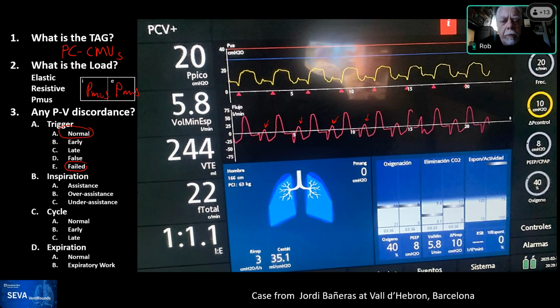Different ventilators have different refractory periods. What that means is every ventilator will put in a short period of time right after the breath ends, after flow goes through zero, where during that time no trigger effort will be recognized, so that you don't get breath stacking. Ventilators build that in for every mode that has mandatory breaths, but there are no clear rules, and oftentimes you can't even tell in the operator's manual how long that period is. So that was probably a more likely explanation, because that peak in flow crossing zero is still very close to the end of the preset inspiratory time.